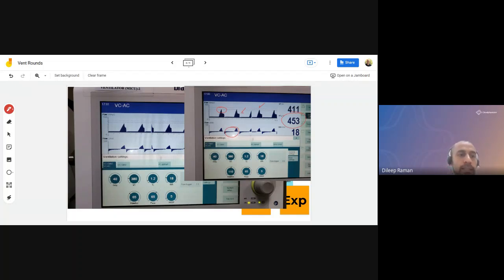But what I'm trying to show here is that in the speed of pressurization, the ventilator hit the tidal volume faster in the flow acceleration part that was 110. So here it hit the 380 faster, so it stopped, and it gave you more time where the breath is sitting at plateau and then transition. There is more time here.